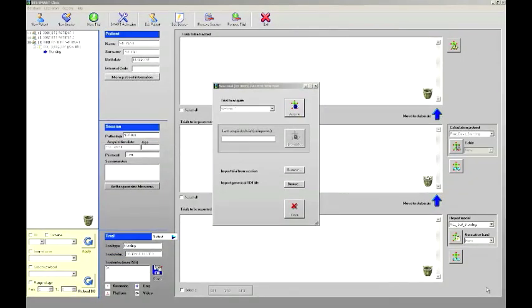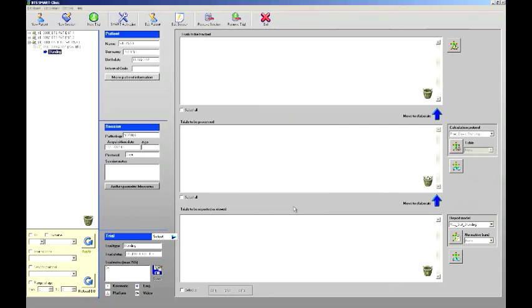Before going on with the new acquisition, we suggest to exit from the acquisition panel and process the standing trial in order to assess the offset angles. Double-click on the standing file. As you remember, it has been already tracked, and so it will be loaded in the processing panel. Select the protocol Davis standing and click on the button to run the processing.